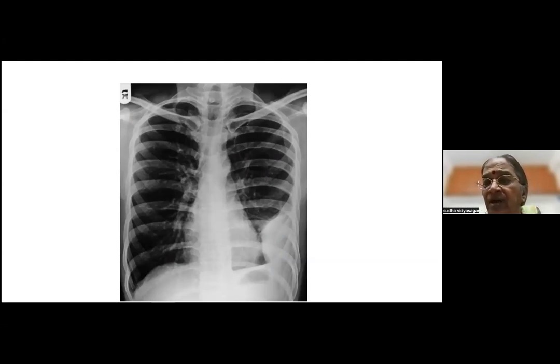Okay, somebody asked, can we differentiate pleural and parenchymal fibrosis? Parenchymal fibrosis will be in the parenchyma. Pleural will be more towards the pleural side. Okay, that's the best way. And there's much more fibrosis in a pleural fibrosis. Okay, somebody again called it a pneumomediastinum. No, we are imagining a lot of things, right?